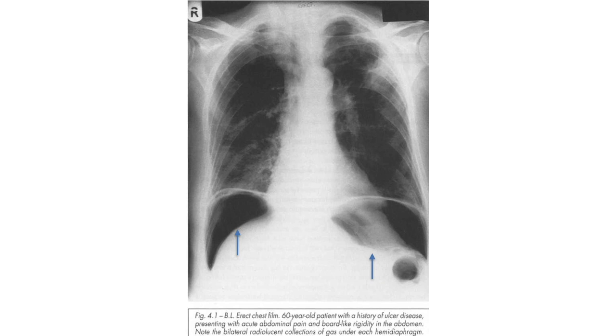Remember to freeze the video, and then you can compare with other notes. You can Google what is pneumoperitoneum. You want to see more images about pneumoperitoneum, which is good. They could help you to understand the pathology better.